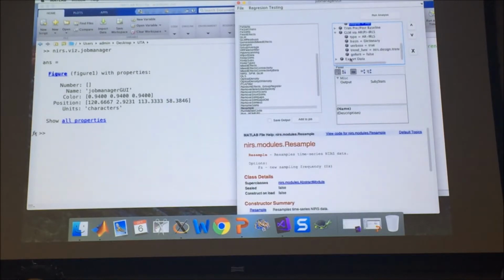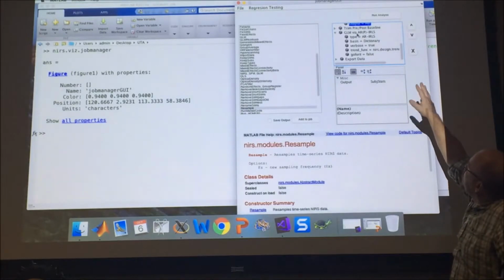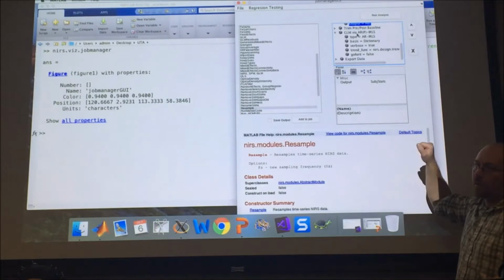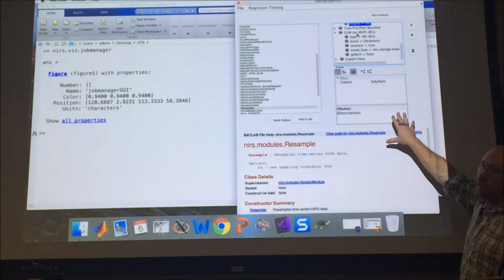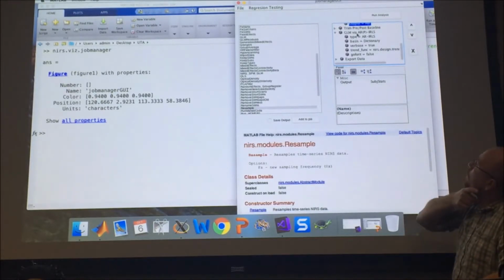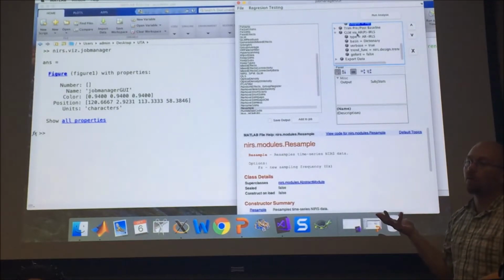And at the end, it's going to run this general linear model. What the general linear model is going to do is, you see the type is this AR-IRLS, which is the autoregressive model that I talked about before the break. The basis set, unfortunately some of these fields you can't edit from this GUI because they're a little bit more complicated. You have to do it from the command line. Basis set is one of them. The basis set is what canonical model I'm going to use in my general linear model.